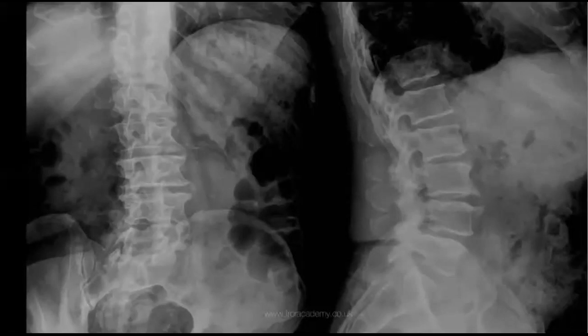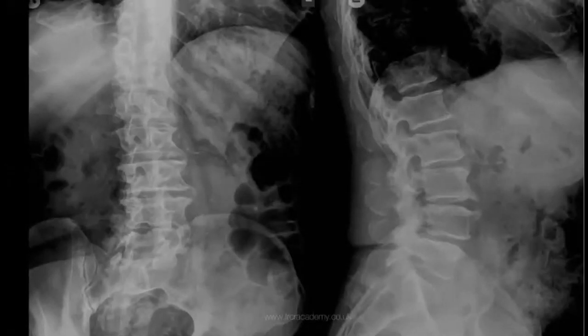So who is still awake with us in this session? What is the pathology here? We have about 7 pictures. The radiologist start today who can score all of them. So which pathology is here?